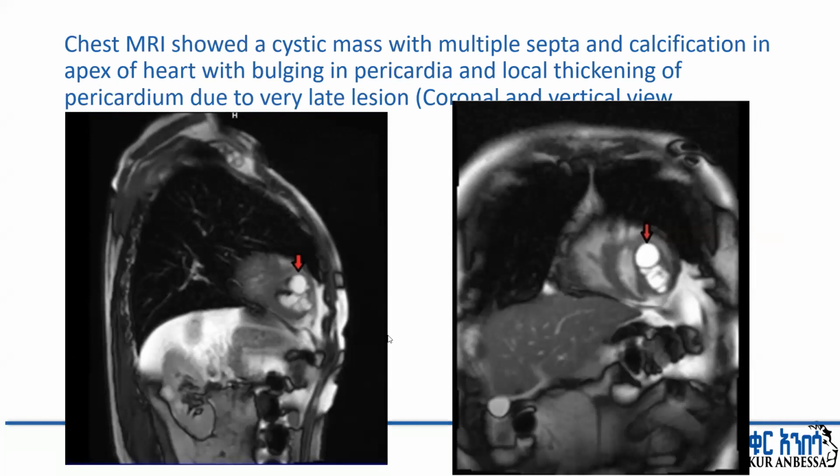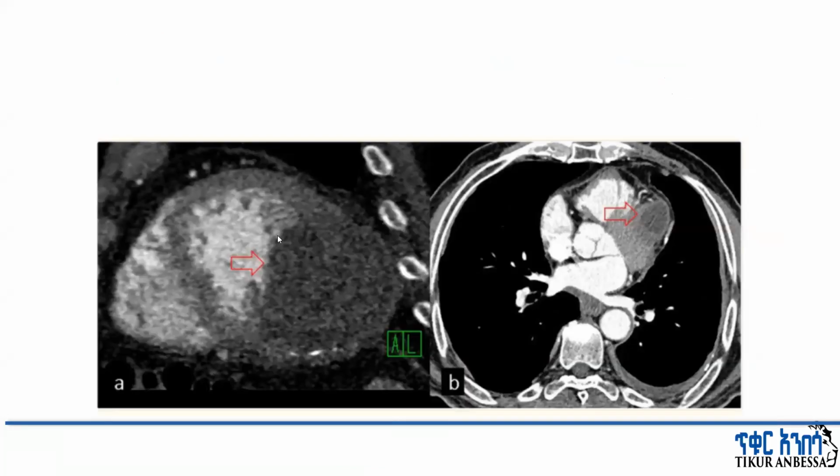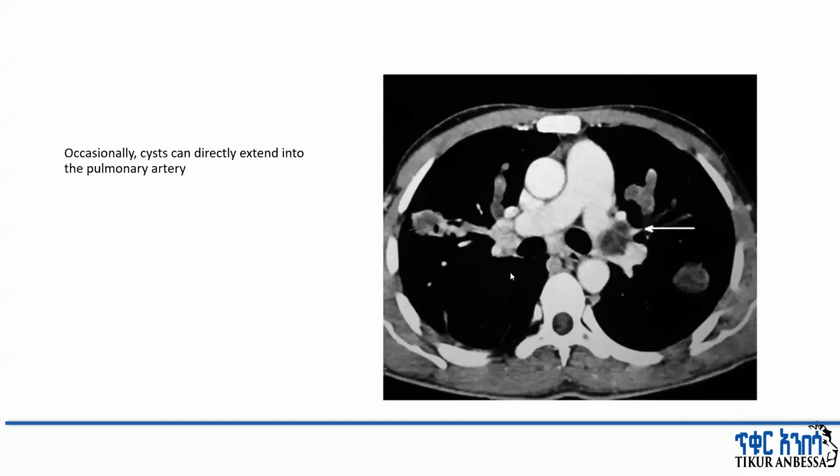You can see fluid associated with inflammatory conditions. Here you can see the same left ventricular lesion. One can suspect a ventricular aneurysm, but you can see the septum, so in an endemic area you can also put hydatid cyst as a differential diagnosis.